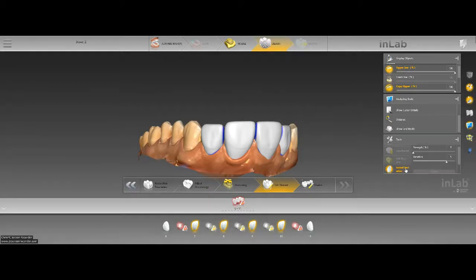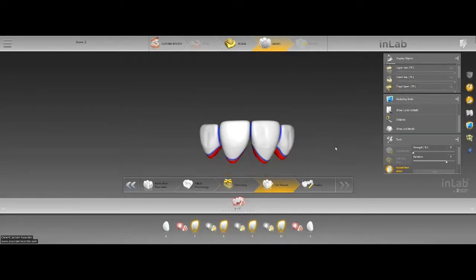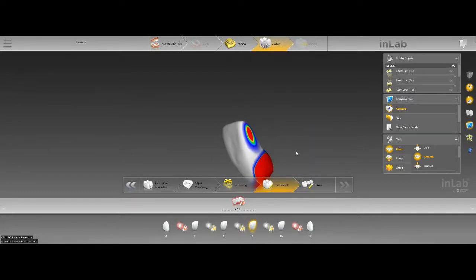Okay. Last thing we want to make sure that we do is turn off our upper jaw, turn off our biocopy, and select just one restoration at a time. And we want to make sure we don't have red intersections between each individual portion of this wax up. Otherwise, we won't be able to separate the shells in Mesh Mixer, which is a critical step. So we'll go to tooth 9. Go to 10. We want light blue.